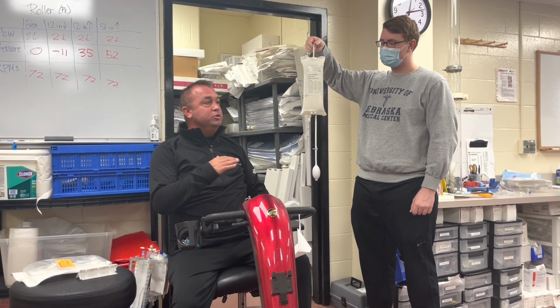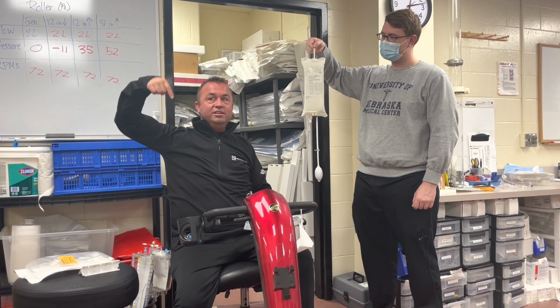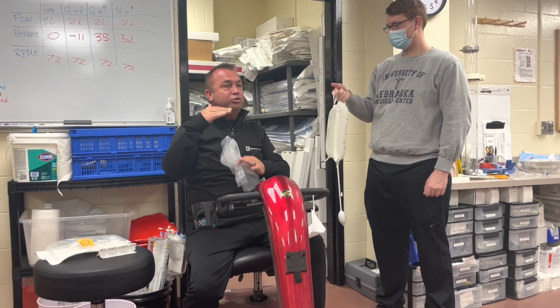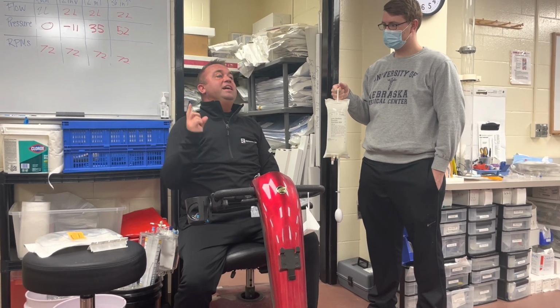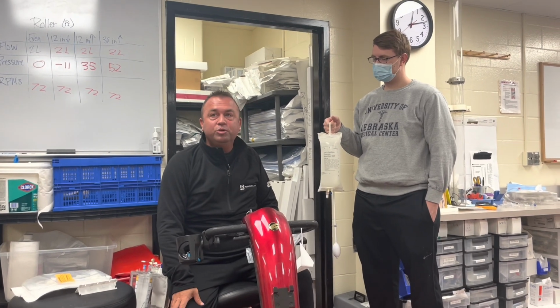Okay, on normal fluids without a pressure bag, the higher you put that, the more gravity is going to affect it, which means there will be a greater difference between the pressure of the patient and the height. So you'll see anesthesiologists once in a while, if they're giving blood or giving a fluid, that IV pole will be up, they have to stand on a stool to get up and get their fluids and things like that.